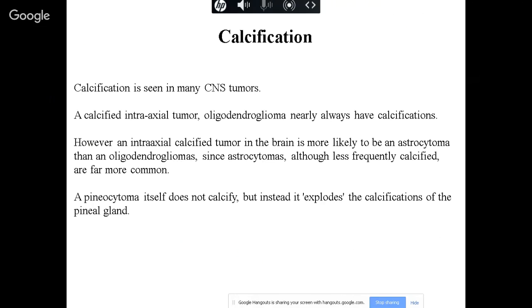So fat, okay. After you look at the fat, you will look at whether or not there's a calcification. Remember, for calcification CT scan is much better than MRI. I still believe CT scan is better for the hemorrhage. But of course, right now we have GRE, we have other sequences very sensitive for subarachnoid hemorrhage. But the first line is always to look at the calcification.